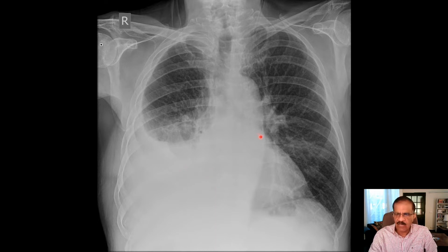But the most important thing, which is the characteristic of pleural effusion, is the upper border. You see, the upper border of the pleural effusion is always like this, curvy linear. This is the most dependent part. On both sides, it rises up, more prominently on the lateral side. You can see this goes up like this. In this case, it goes, I think, quite up, but normally it goes up to this. So you see the curvy linear upper border. This is also called meniscus sign. And I think after you have picked up all these abnormalities, it is fairly obvious that this is pleural effusion.